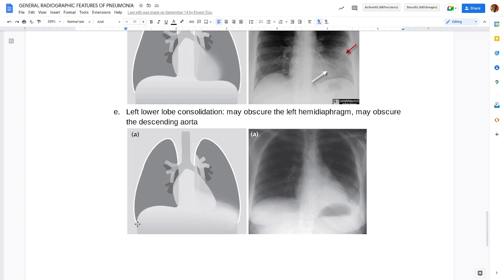Even that border is supposed to be very clear, the way it looks like that. So if it was affected, check on the opposite side, the lung on the left. Have you seen how it looks blurred? You can clearly see that. The actual problematic X-ray is the one on the left here. You can even check on the actual X-ray that is matched to that. You can see that you can't actually follow the diaphragm. So that's the silhouette sign, another characteristic feature of a pneumonia on X-ray.